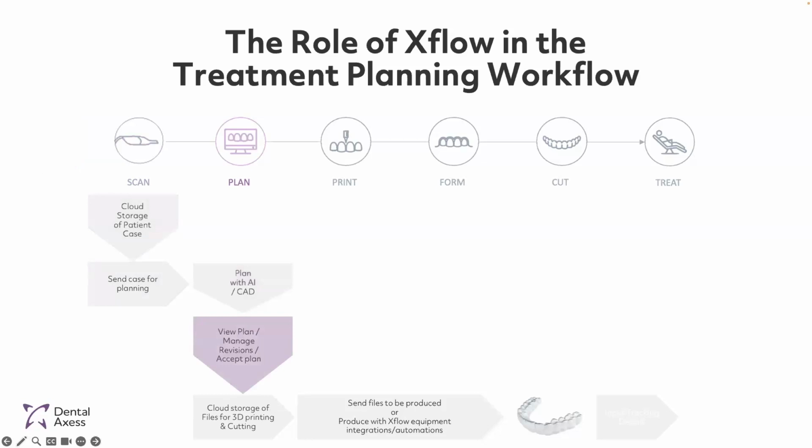Now, once your planning process has been completed and the case has been approved, Xflow facilitates a seamless review cycle, allowing practitioners to view, approve, and track the progress efficiently across the cases and orders. Now, after you've approved your case, Xflow then allows you to store all those design files securely, providing a centralized repository for easy access and management under one patient record.